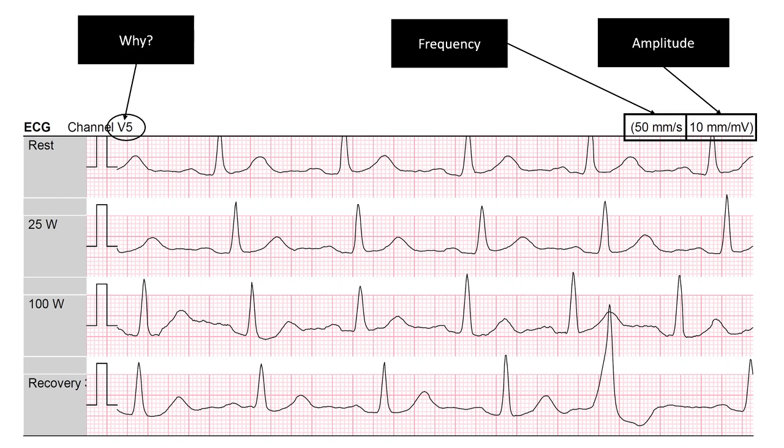Remember, this is also important because, for example, when we evaluate left ventricular hypertrophy and we count the S wave of V1's amplitude and sum it with the R wave of V5 and get more than 35, we note that the person has left ventricular hypertrophy.